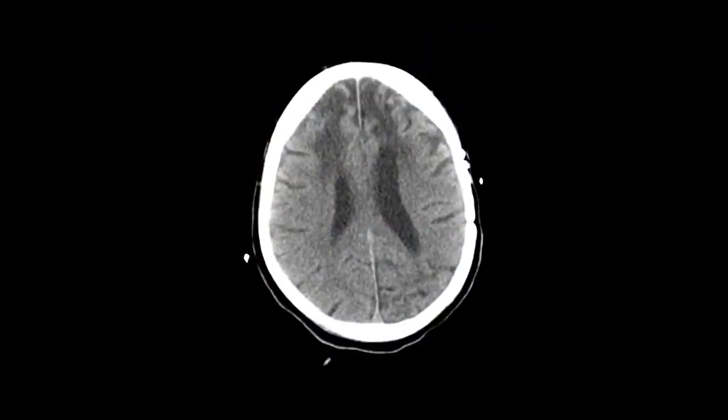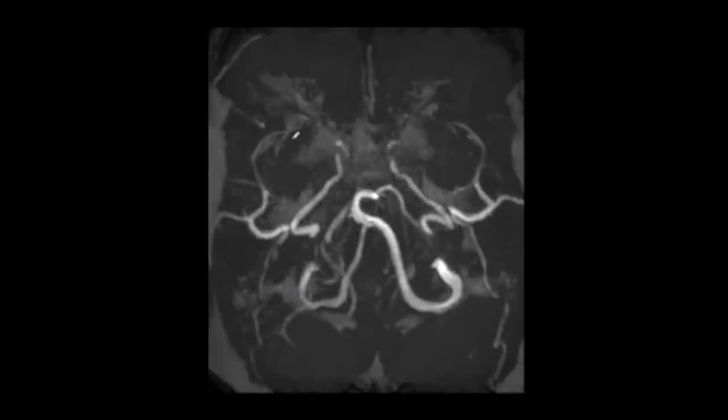Now, this patient has encephalomalacic changes along bifrontal lobes. And when you look at the MRA, this is the internal carotid artery. It just stops. I don't see the expected ACA. I don't see the MCA. Instead, I see this vague signal change. And this is the posterior circulation. It looks normal.